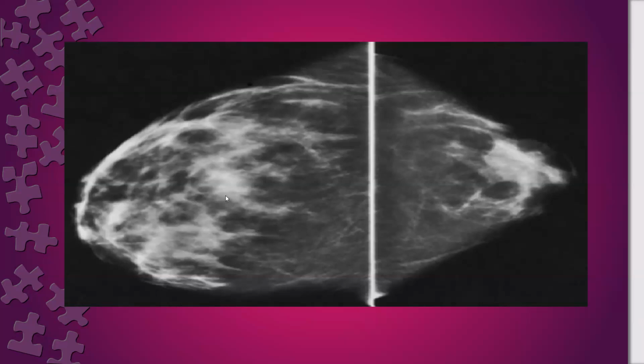Yes, you said what? Asymmetrical size. Excellent, well done. The observation: there is asymmetry in the size, one thing. And the glandular tissue is also much smaller on the left breast compared to the right. This is the right breast and this is the left breast.